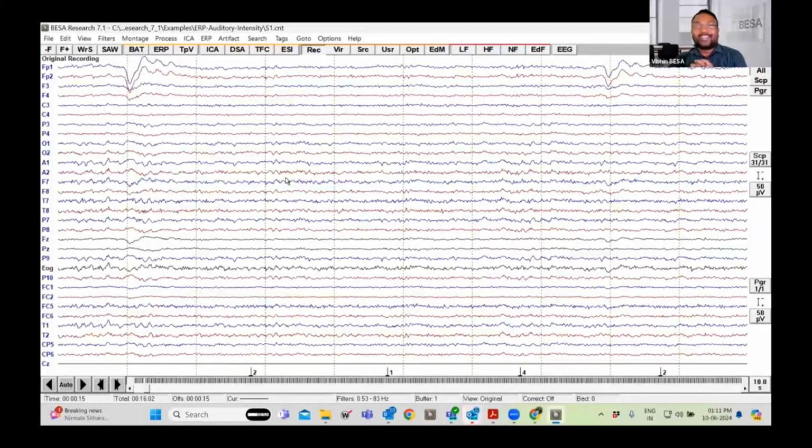You also have some kinds of muscle artifacts and electrode pops. Doing this basic review will help you understand and interpret the output of the processing. Just let me know if you have any more queries on what we have explained now.